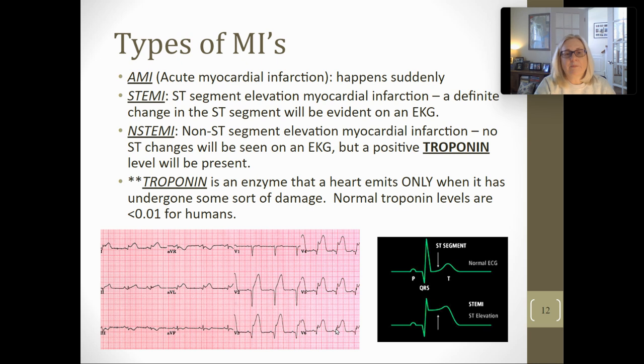Yeah, okay. So technically, there's 3 blockages that this cardiologist needs to look for when they go in there. They're looking in the lateral region across the top. They're also looking anteriorly and apically. There's potential of 3 different places this person has a blockage. So this EKG is vital, critical for them to help them to understand where they're going to look for any blockages. All right, let's keep going.